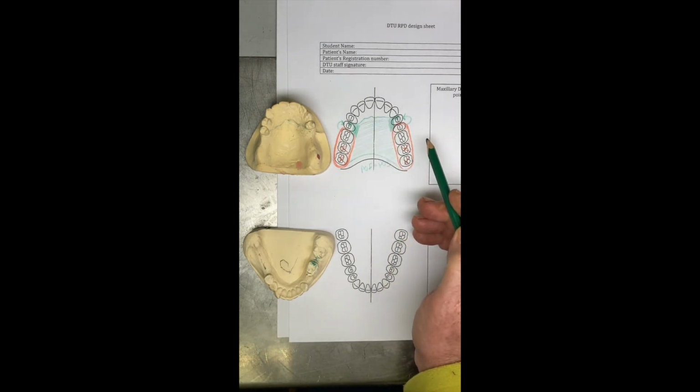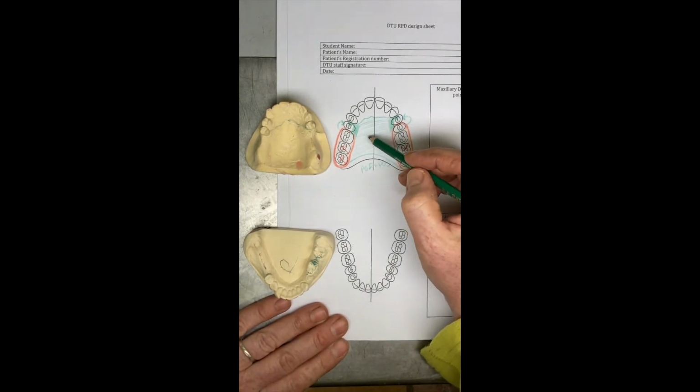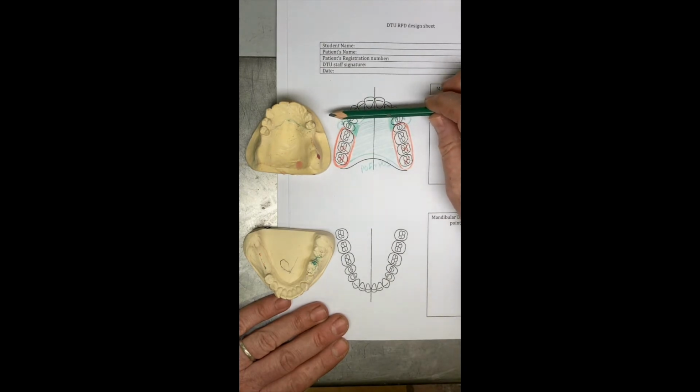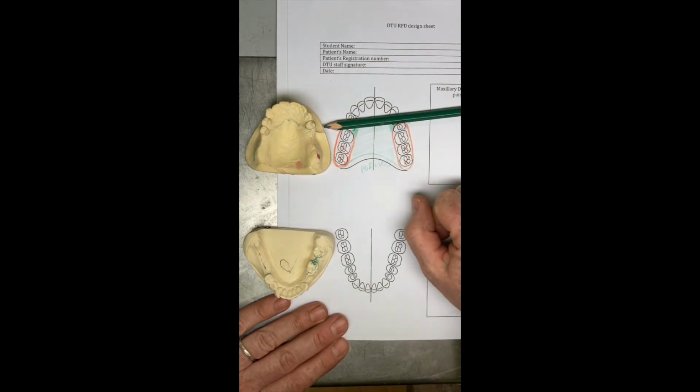Can we do anything different? Can we make any improvements? Well, of course we can do different things. First of all, with regards to indirect retention, this is a classic case for indirect retention. So thinking about what happens when we pull up on the occlusal surface of these artificial teeth, the clasp tips will get stuck in the undercut, and we're going to rotate about my pencil just here.